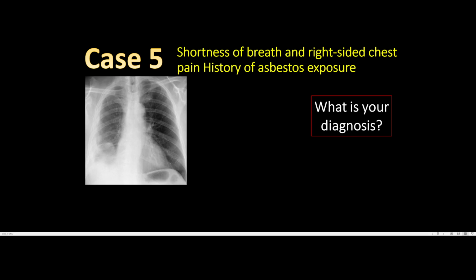Why? Because this patient is more than likely to have interstitial lung disease in the form of asbestosis, and if it's a long-term case, that more than likely led to the development of pleural malignancy or mesothelioma. And how does mesothelioma appear? Well, let's look at the chest x-ray.